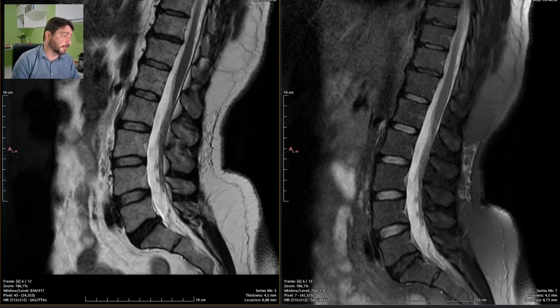So let's just summarize the report to make it easier for the referring physician.